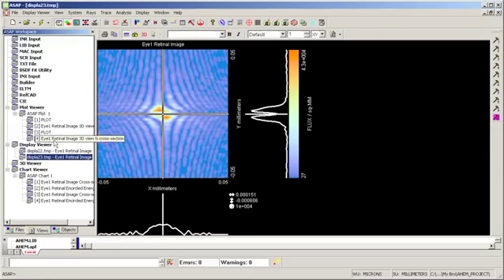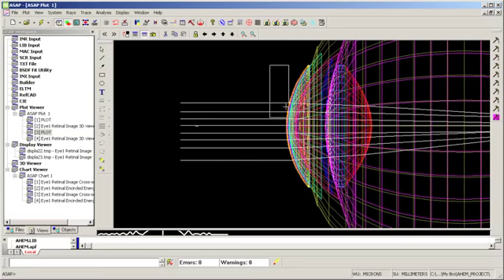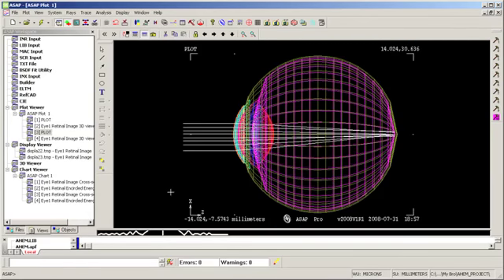So this is my contact lens. Right here, we can zoom in on it. It's a toric contact lens. I can zoom in a little more here. You can see this layer on top of the cornea. It's a different color than the cornea. So that's contact lenses in AHEM. You can either import your own from CAD or generate one in ASAP to load into AHEM, and then you can reposition it with the splash screens.